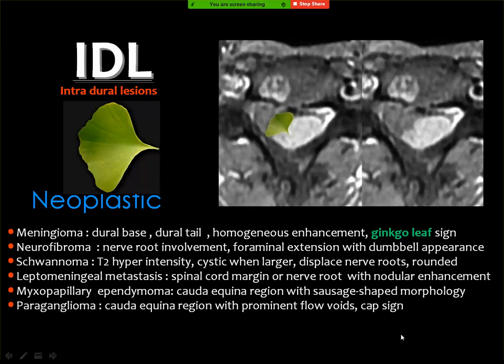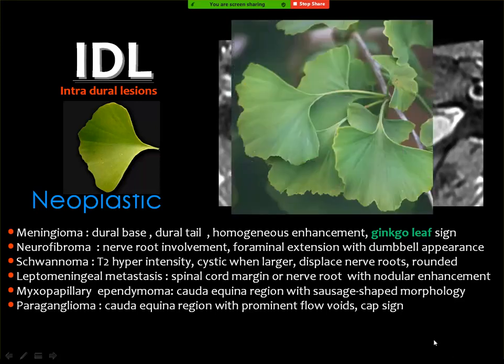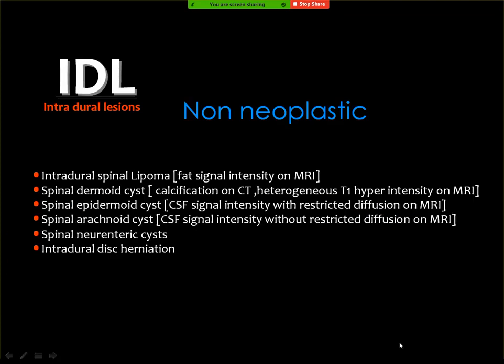I don't know if I pronounce this right or not. And this is the correlated image. This may be seen in some cases and help you to spot the diagnosis of meningioma. Then there are some lesions occurring intradural, but they are not neoplastic, like lipoma, for example.